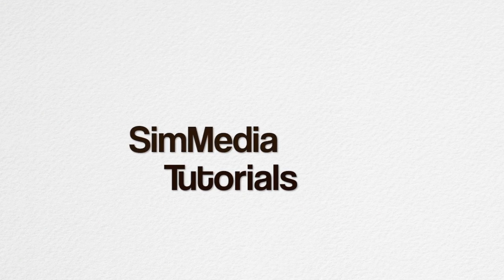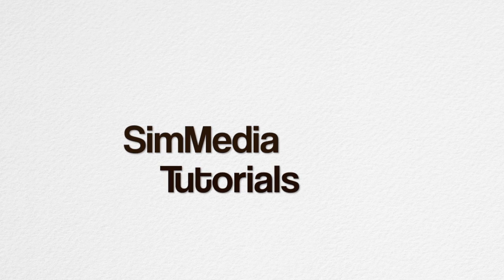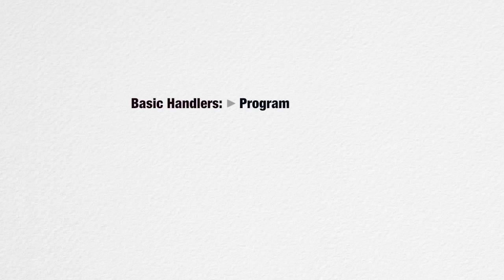Hello, in this tutorial I'm going to show you how to program a handler and how it can save you time during a scenario, leaving you free to focus on the learner instead of the computer. A handler allows a learner's actions or event to trigger a patient response or action, no matter where you are in a scenario.